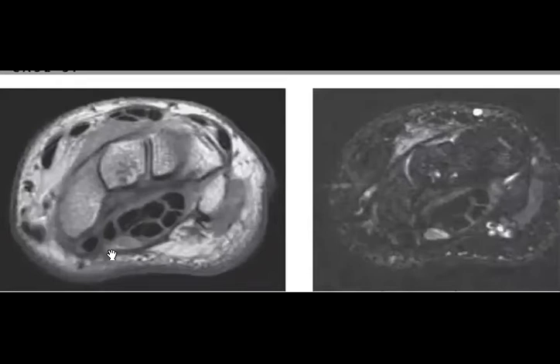And he was consistent. So this patient comes to you with tingling in the hand. Look at the median nerve and look at the high signal of the median nerve, right? Perfect. So what do you expect in the STIR?